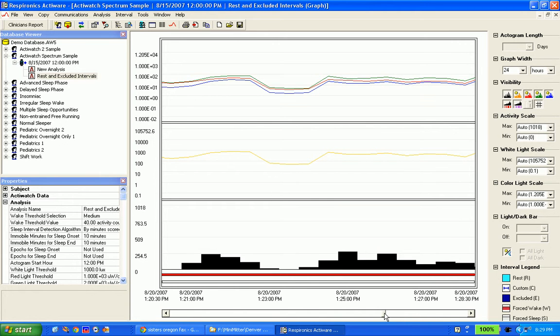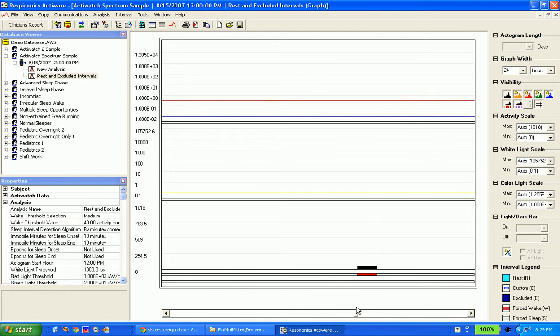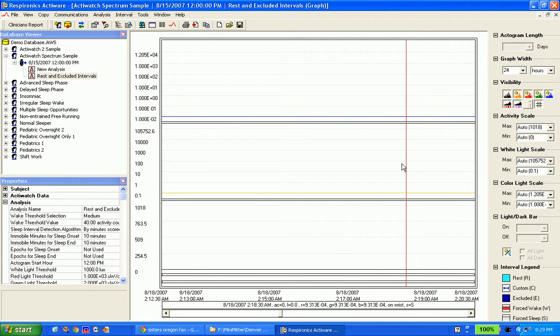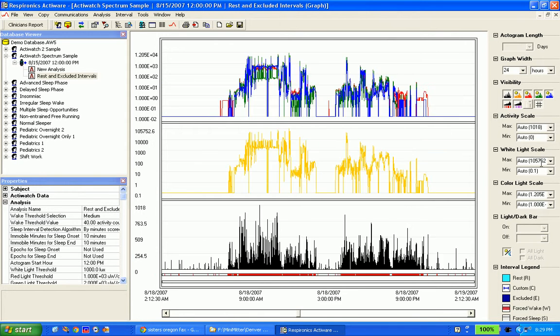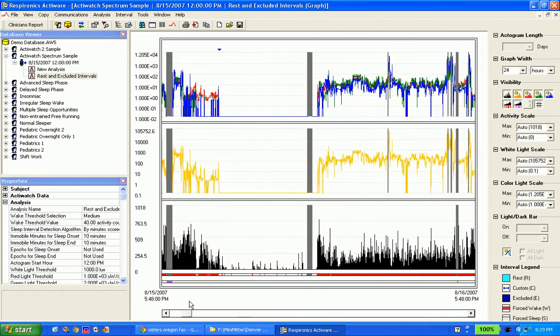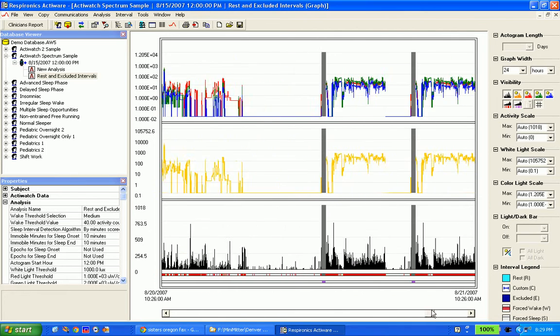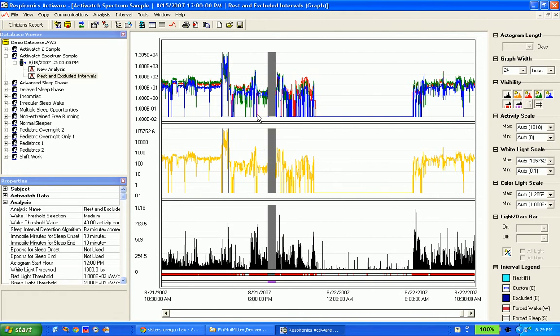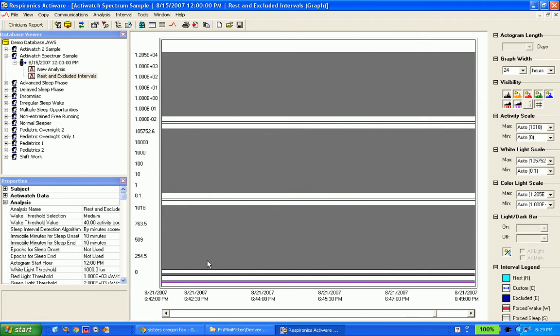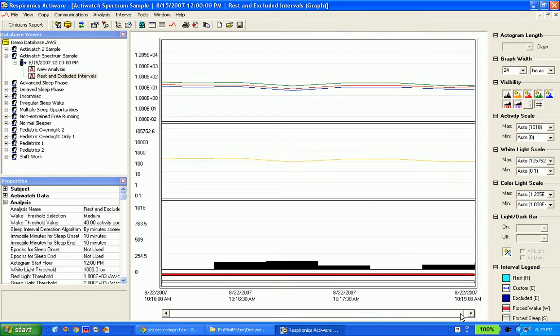If I were to scroll through this right now, it just goes forever and ever. I mean, it's really large. If I double click on this, it'll take me right back to the beginning. But you can see that right now we're moving really slow. We're covering the same amount of points. It's just more compressed. So if I keep zooming in on this, you'll see that eventually that black part becomes the whole screen, and I can keep doing that. So it actually works really neat.